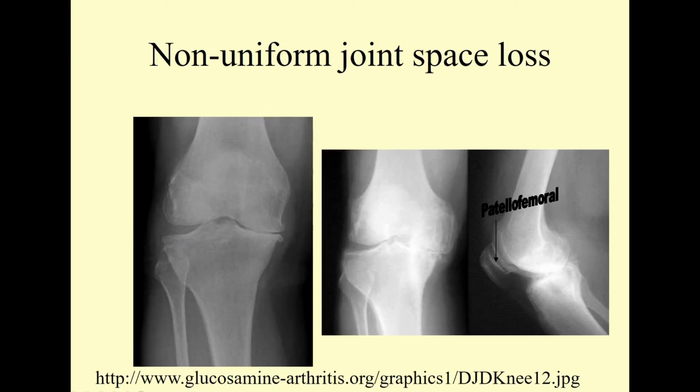So we take a look at this image over here. Hopefully we can appreciate the loss of medial compartment. Medial compartment of the femoral tibial joint is most common. And in this case, we have osteophytes both on the tibial plateau, but beginning to present themselves on the femoral portion of the joint space. Normally in the middle, we find 2 peaks of the tibial eminentiae, and the femur is settled down so thoroughly because of thinning of the articular cartilage that it's remodeled and flattened those tibial eminences.